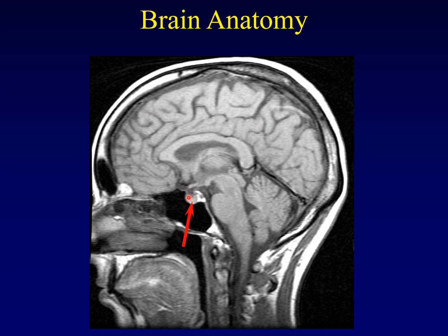What's this item hanging down off the bottom of the brain? This is a gland, and it's got its own little house to live in here. That house is called the sella turcica, and this gland is the pituitary gland hanging down. It is surrounded to variable degrees by the sphenoid sinus, right? That's got air just like the air out here, just like the air in the nasopharynx. The sphenoid sinus filled with air surrounding the sella turcica where the pituitary gland lives.